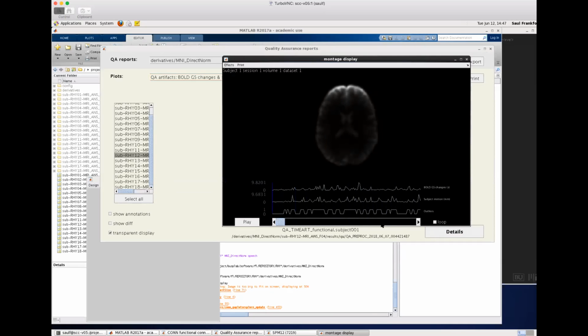Wow, and yes, this definitely moved a lot. The 9 millimeter motion is ridiculously high. There are these big jumps, even after, these little jumps. Yeah, those jumps are residual effects because the motion happened to be caught within the time of the scan. Then there are all of these artifacts that cannot be corrected just by a realignment.